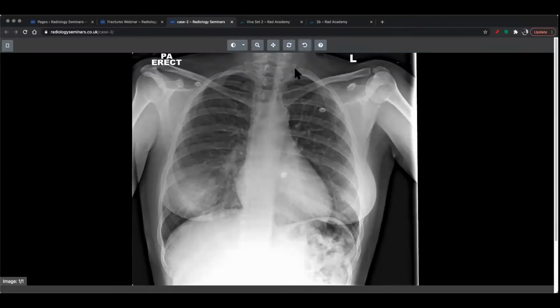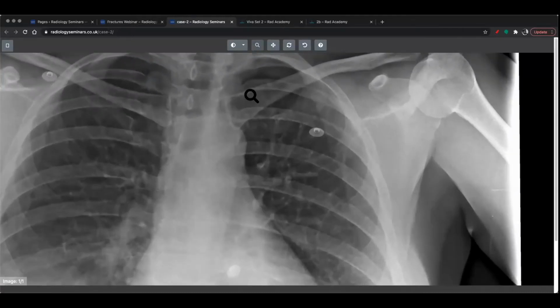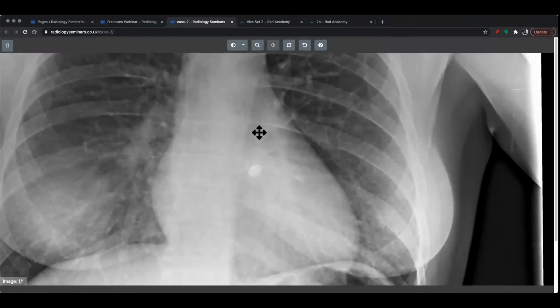pneumothorax. Apical pneumothoraces are things that people often miss. They really do miss apical pneumothoraces, and I will have a good case of it coming up. But if you ever think you've seen a pneumothorax, just try and point out where the lines are going. Just follow the line, and usually you'll find it's not a pneumothorax, it's actually the border of the ribs, or the border of the scapula that's making you think that there could be a pneumothorax there.